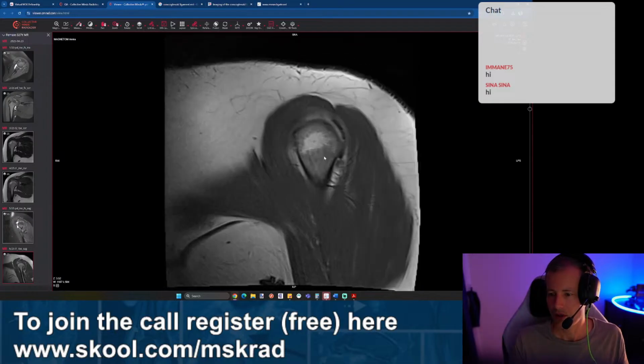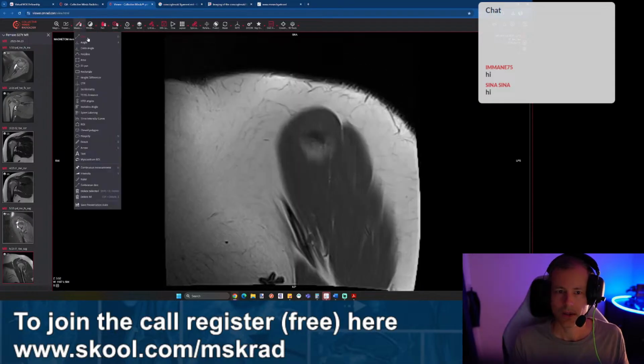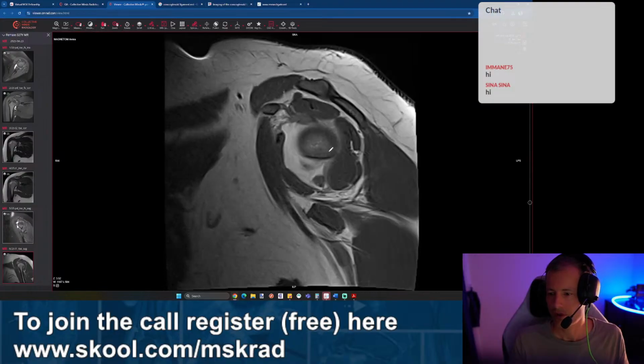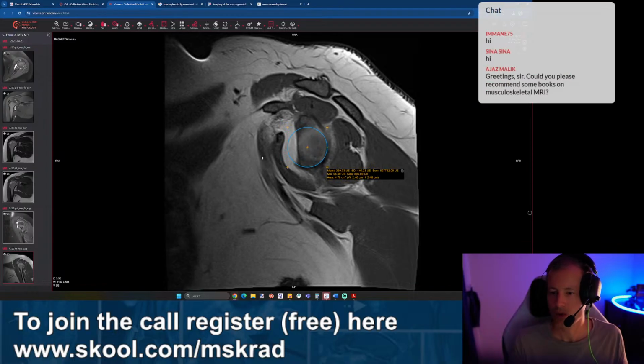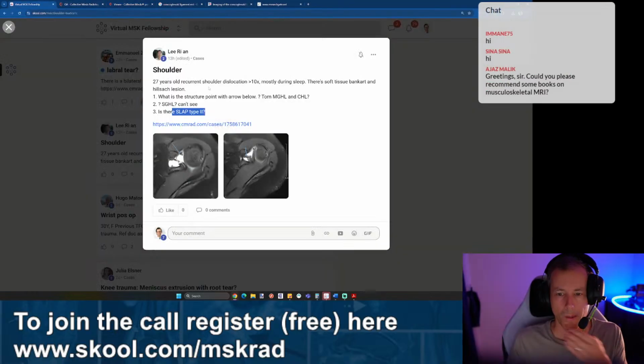And what am I doing? And the loss of the circle, or best fit circle rather. Maybe put this on here. You can see there's quite a substantial piece missing. Okay, so let me just answer this.